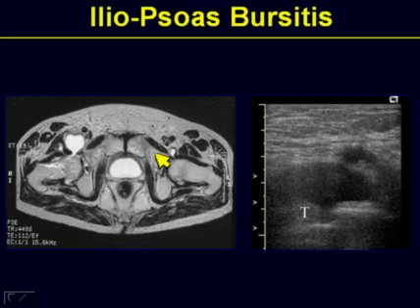Sometimes they may be quite small and yet approachable by needle guidance. Case in point in this example, on the right hip of the patient who's lying down, and you're looking at the patient from his feet, you'll notice that there's a heart-shaped collection of increased abnormal signal, should be representing fluid.